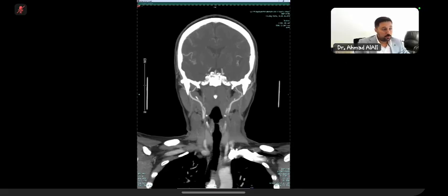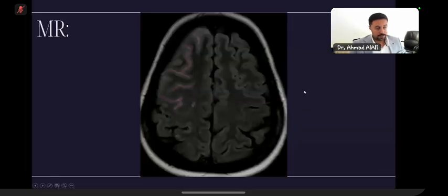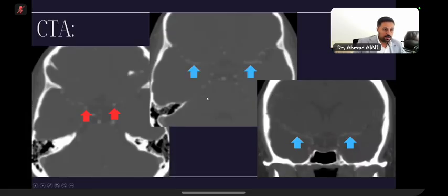Thank you, candidate number two. Please stay with us. For the time factor, I will have to take over to go through the case. Okay, so you can see this slice. This is the axial FLAIR images that candidate two described very well. There were hyperintense FLAIR signals in the right side of the brain, frontal, parietal, and Sylvian fissure. So in both contrast images and CT angiography, these red arrows point to the internal carotid arteries. They were really narrow.